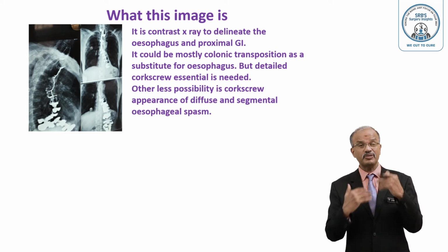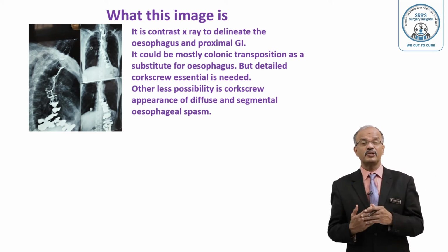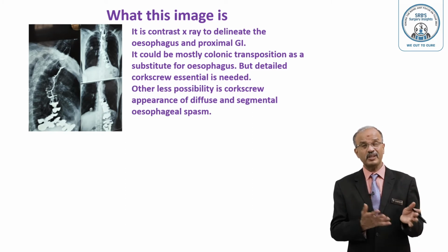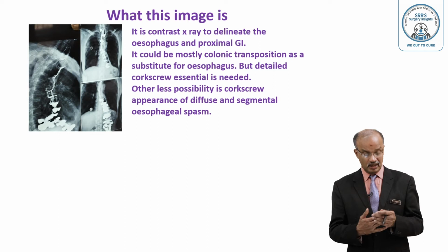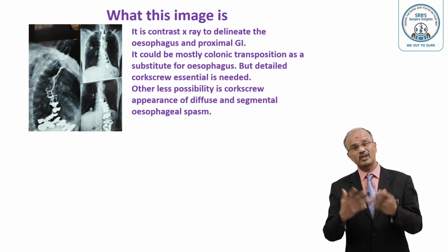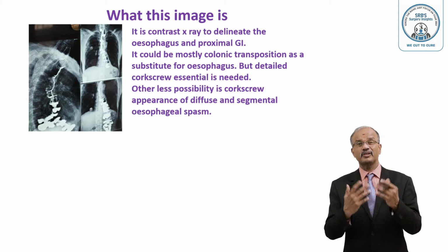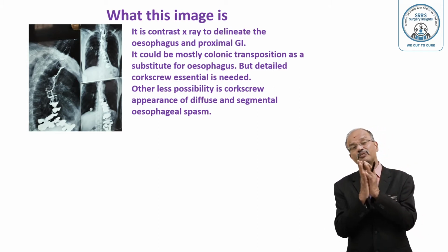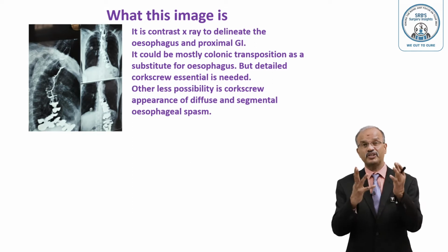So this is a barium study contrast. Currently, of course, other newer contrast agents are used for contrast imaging of the GI. Gastrografin is used, other oral contrasts are used. Iodine contrast agents are used orally. But the traditional one is barium, microbarium sulfate, called Microbar.